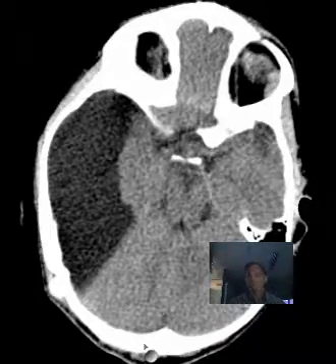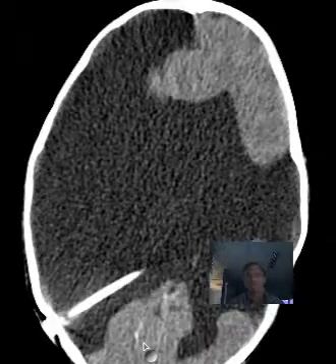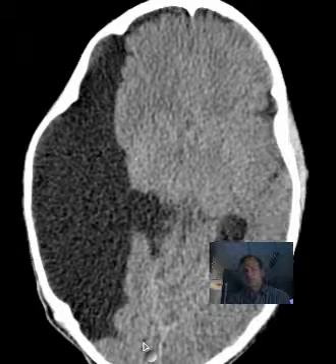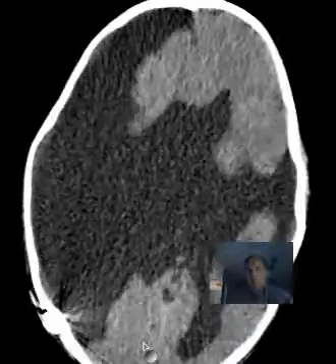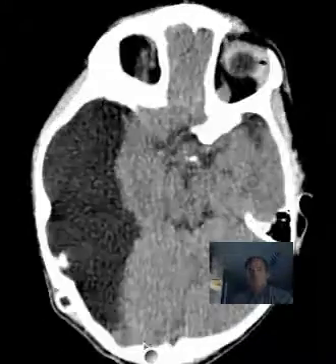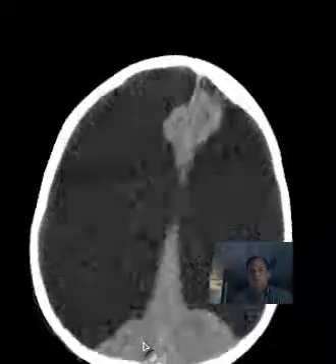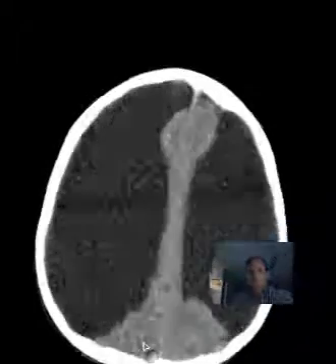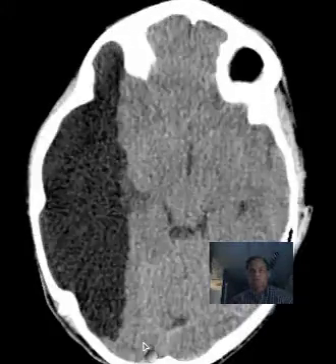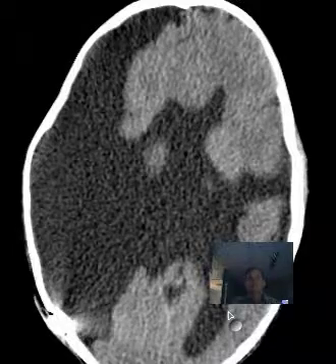So it's not just the absence of middle cerebral artery territory to one extent or another bilaterally that suggests this was probably at least partly an arterial occlusive problem, but the fact that we can also see corresponding areas of preservation, including anterior cerebral arteries superiorly here, and posterior cerebral arteries in the occipital and posterior temporal area. At least on the left, the posterior temporal area is preserved.